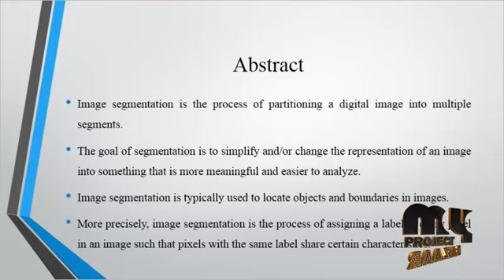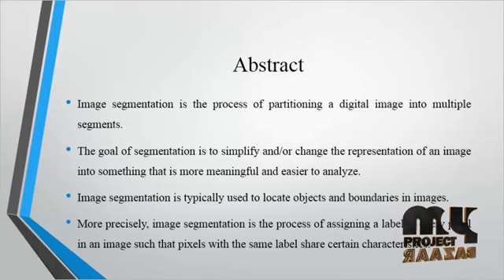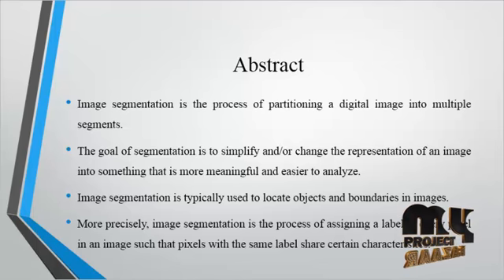So image processing is mainly used to detect the brain tumor region, as well as to classify what type of tumor is affecting the brain region. This most precisely segments the affected region and also classifies whether the tumor is present in the image or not.